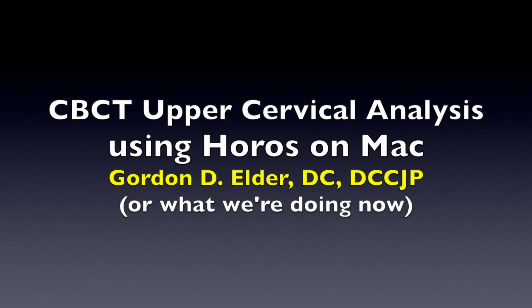This is Dr. Gordon Elder, Director of the Blair Chiropractic Clinic. It's February 15th, 2025, and I want to just document exactly how I am currently analyzing a cone beam CT scan. It's primarily a Blair analysis.